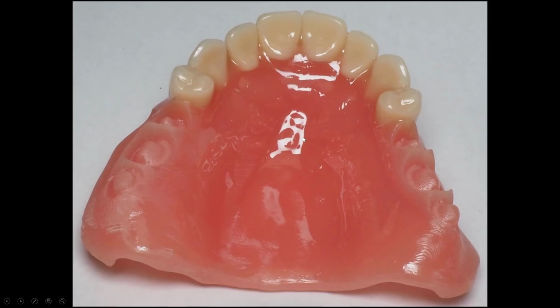I like to hit it with a hair dryer too, because the warm air will burst any bubbles that you may develop with your paintbrush as you're brushing that on, and it smooths things out with the heat, gets it nice and glossy. And then once again, hit it with your composite curing light, and then once you've done this, the teeth are tacked into position, stick it into your UV curing oven and let this get its final cure.